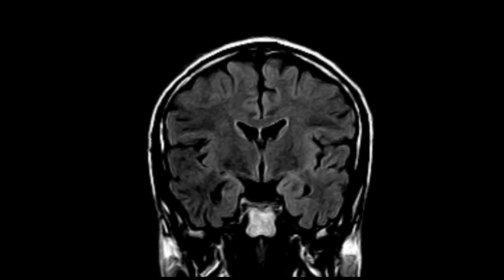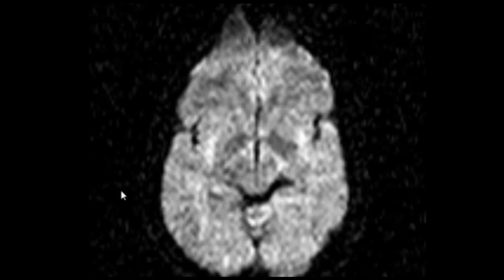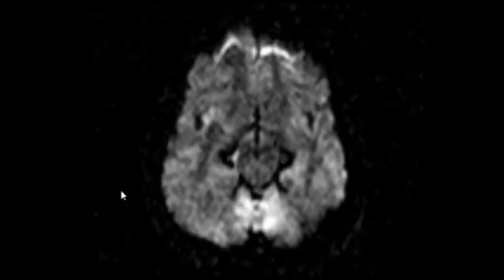MTS can be unilateral, can be bilateral, can be symmetric, can be asymmetric. Yes. So this should be reported as a case of mesial temporal sclerosis, bilateral, more on the right side. Properly, there is something called volumetry, when we measure the volume of the parahippocampal gyrus, but we will not. It takes too much time and is a complicated process, so we will not do it now. Okay, and there is no diffusion restriction. Don't worry about this. Okay, now.